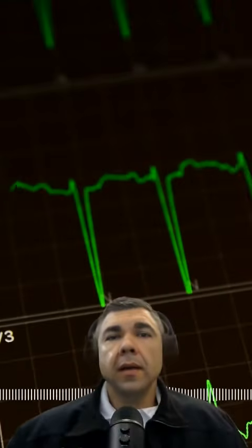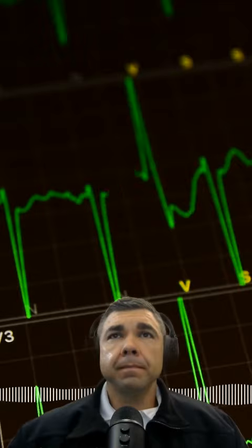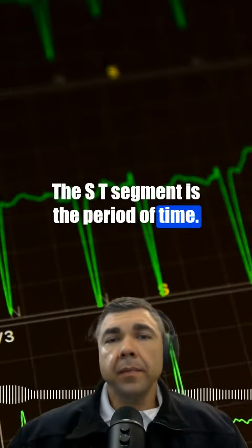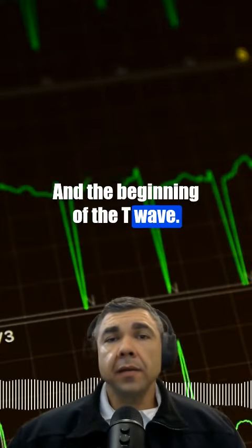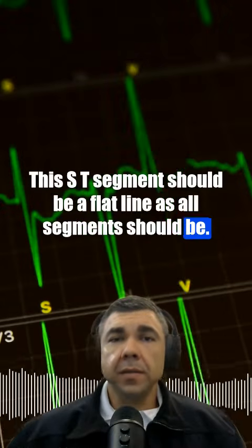Talk about ST segment elevation on the electrocardiogram. On an EKG, the ST segment is the period of time between the end of the QRS complex and the beginning of the T wave. This ST segment should be a flat line, as all segments should be.